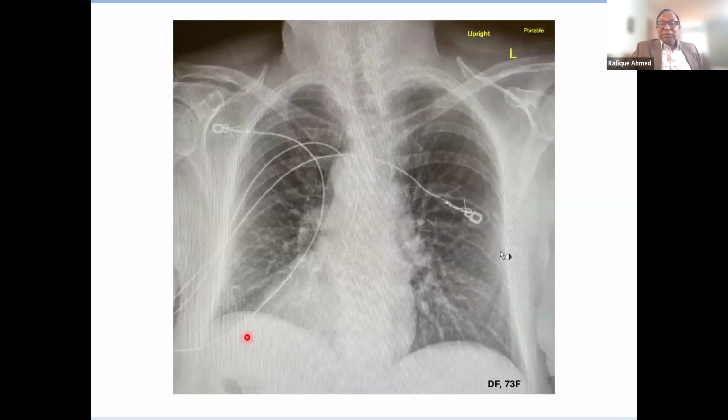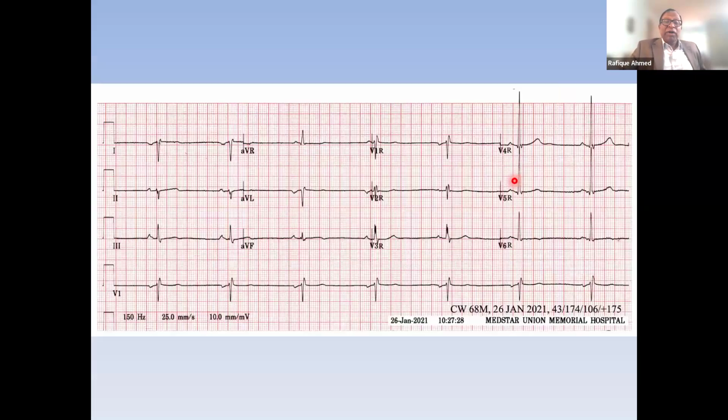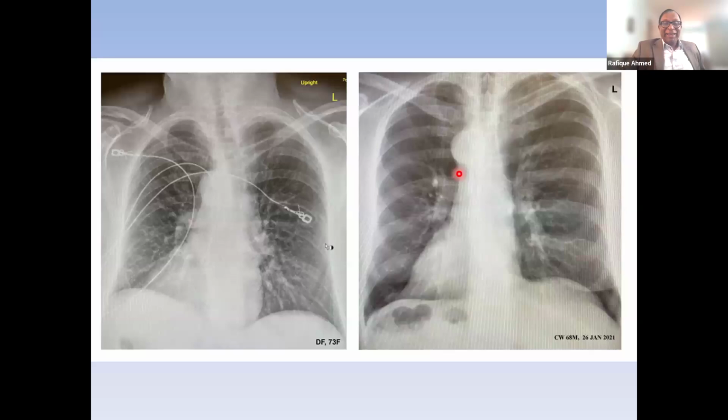It's dextrocardia. So I have another patient with a similar ECG. We thought dextrocardia. We corrected the chest leads, but not the arm leads. Look at how it looks. And the chest X-ray, dextrocardia. Now I have a question. What is the difference between these two chest X-rays? Two different patients, but does anybody have any comment on these two X-rays?